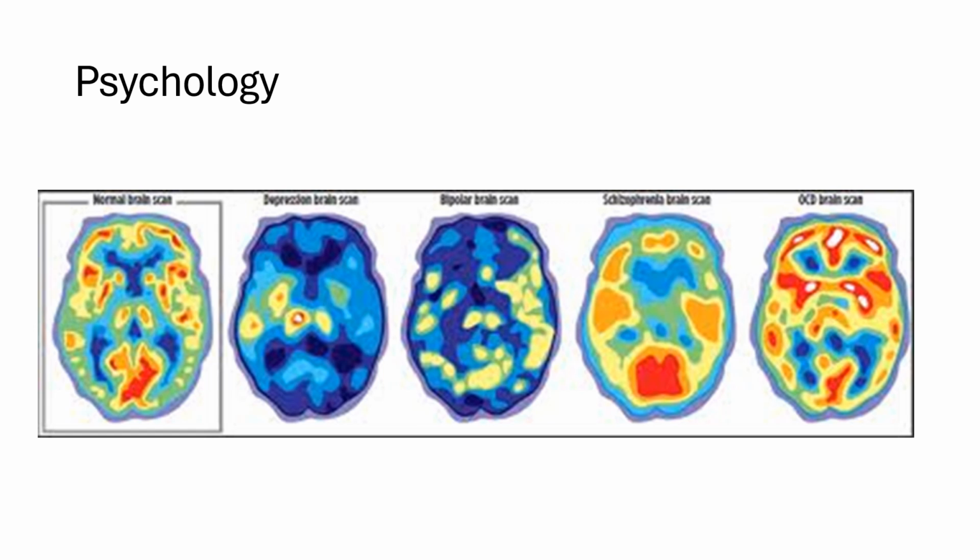And then the brain on the far right is a patient with obsessive compulsive disorder. And you see that the metabolism in that brain is a little bit different as well. You have some areas that are hypoperfused and some areas that are hyperperfused, especially in the parietal and frontal lobes. I do want to point out or remind you that the frontal lobe of the brain is associated with poor impulse control. And so that might be part of the symptoms associated with OCD.